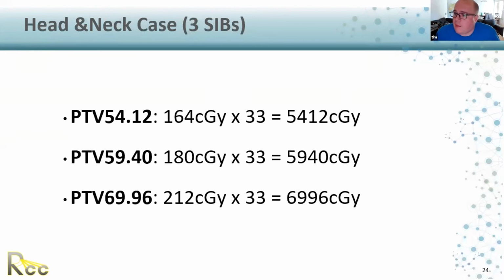Great, that's a wonderful answer. In general, I guess the cropping of the structures is the same, but the margins that you use, the distance you're cropping, would be different for the different sites. Exactly, yeah. Okay, and now we can go back to the mask and the couch. Some people were asking specifically about SRS. Do you need to include the mask in SRS? Yes, and this is a different story. If you are using an SRS mask, this is a totally different story. I spoke about general head and neck cases. I did not speak about the SRS itself. For SRS, the mask should be included.